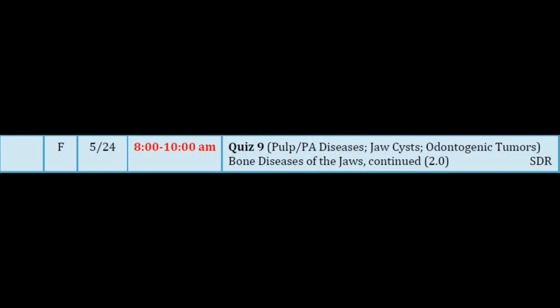So it's well defined, corticated, nice and oval, uniform. Got to be a benign neoplasm. So we put ossifying fibroma in our repertoire of things that we would put on the differential diagnosis for this. And in an adult, 20 to 40, I would put ossifying fibroma top of my list. That's a good one. Did you see any odontogenic lesions that would have this uniform and a mixed lesion?